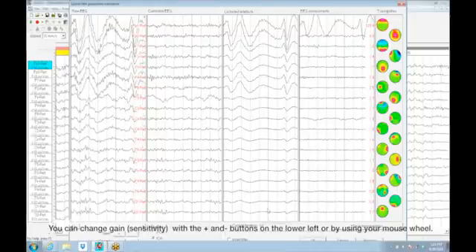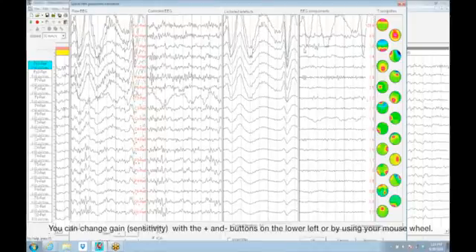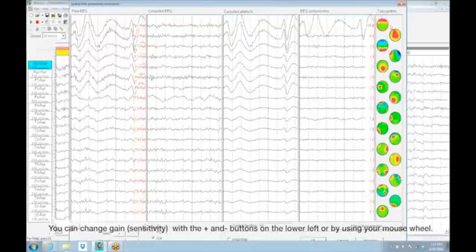If I turn up the sensitivity on this, the eye movement has to have a field from the front to the back with this orientation. Even these small ones have that same characteristic, or they wouldn't be being pulled out. The component extraction of eye movement takes out more than eye blinks.